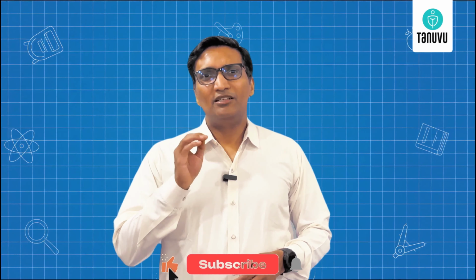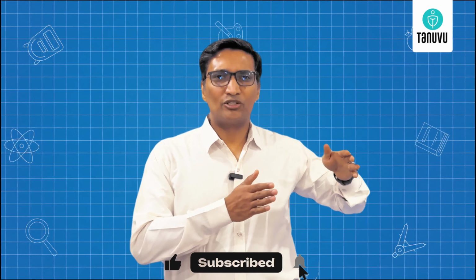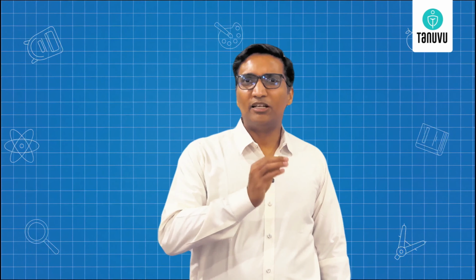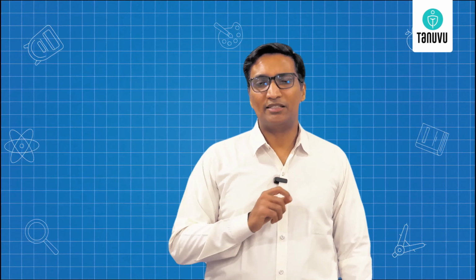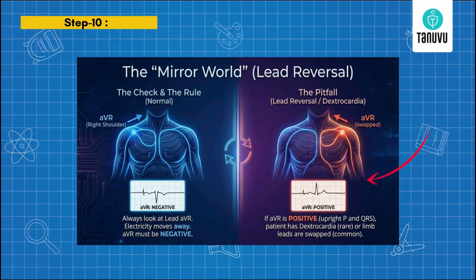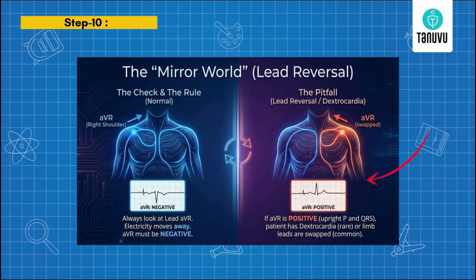Congratulations if you have reached step 10. That means you have understood a lot of things about ECG. Step 10 is a simple error that you need to pick up whenever you look at an ECG. It's called the mirror world. As we discussed, the AVR is the lead which is looking at the heart from the right arm. So all the waves in AVR are supposedly negative because most of the impulses traveling from the SA node to the AV node and then all over the ventricle, the vector is predominantly directed down and out, whereas AVR is looking exactly in the opposite direction.